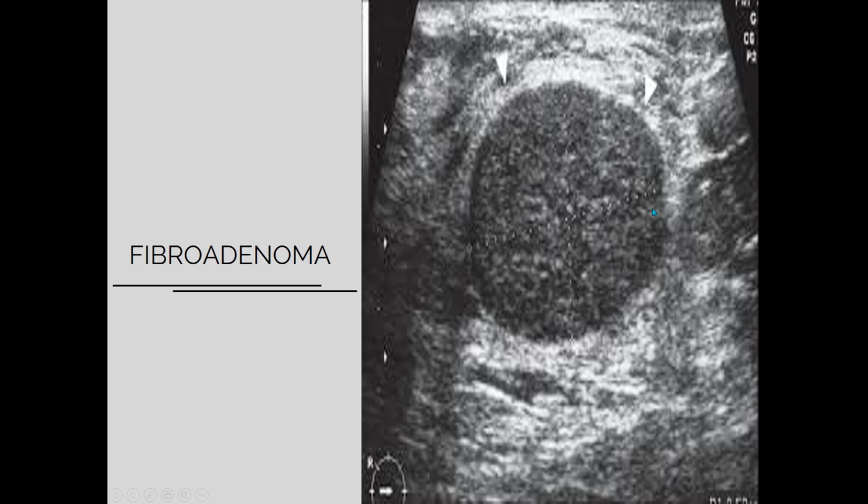Here you can see this is a hypoechoic lesion. This is a well circumscribed hypoechoic lesion. Even this is not lobulated. Lobulation I will show you in the next slide, inshallah, maybe. But actually here this is well circumscribed and this is rounded. Benign lesions are well circumscribed, and may be rounded or oval. And this is hypoechoic, because this is grayish, not very brightly white. If that is brightly white then we must say hyperechoic, but this is not hyper, this is a hypoechoic lesion.